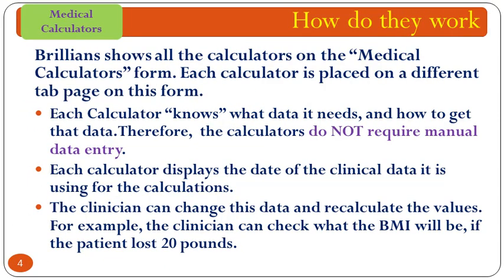So, how do they work? Brillians shows all the calculators on the medical calculators form. Each calculator is placed on a different tab page on this form. Each calculator knows what data it needs, and how to get that data. Therefore, the calculators do not require manual data entry.